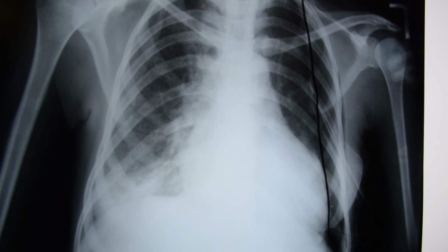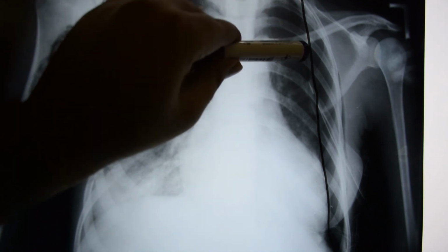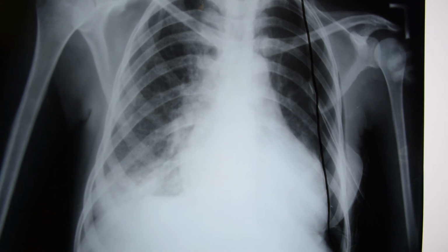So this was a classical case of a pneumothorax in a patient of CKD, and this X-ray is pathognomonic whenever there are no lung markings and a thin border of visceral pleura is traceable here. We can say that this is a case of pneumothorax. To differentiate it from a bulla, which is an air containing space in the parenchyma of the lung, the history is very important.